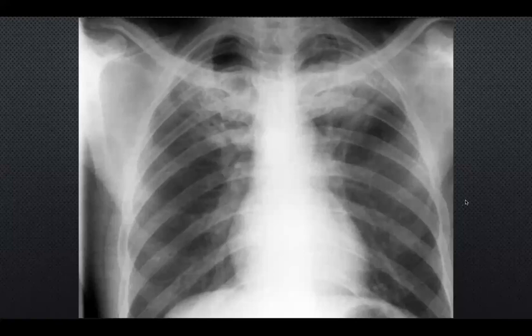Okay, that's great. So I like the system. I think consolidations X-ray. Sorry, what was that? Consolidation. Okay, where do you think there's consolidation? In apex. Yeah, brilliant. That's very good.